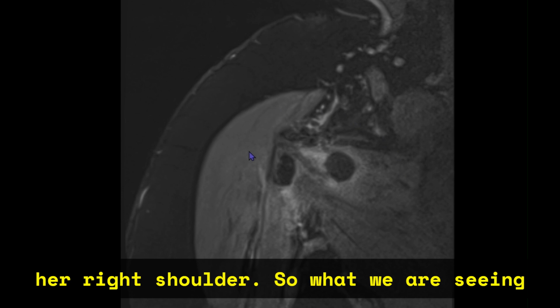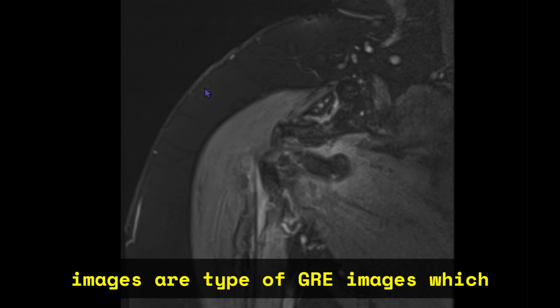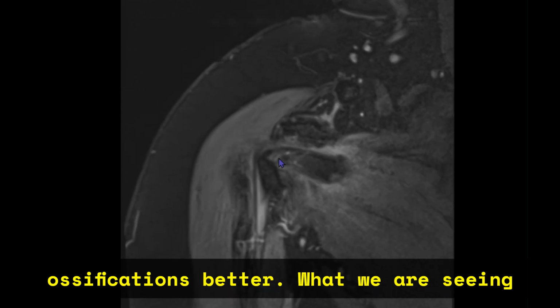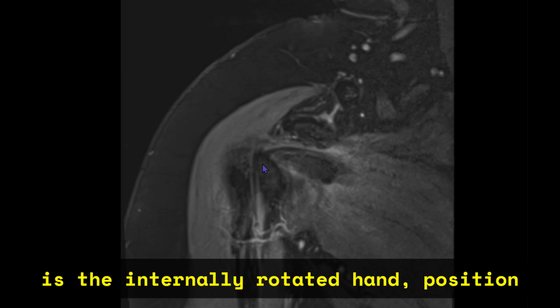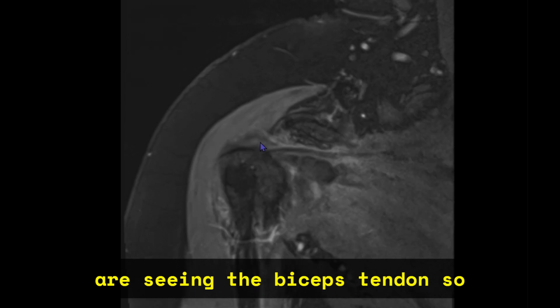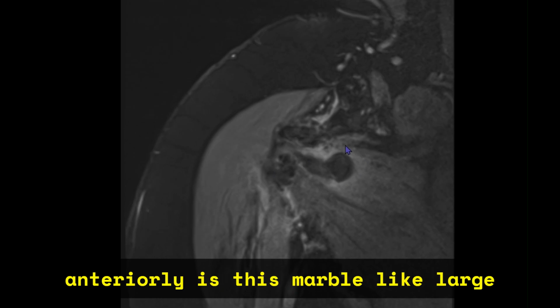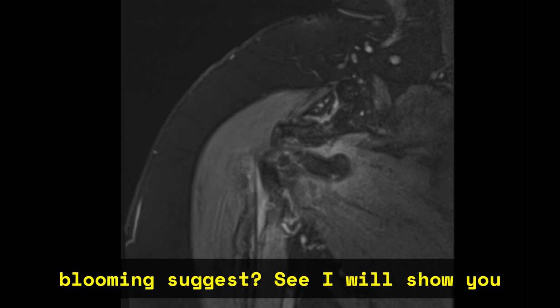So, what we are seeing is coronal MEDIC images. MEDIC images are a type of GRE images which help us see the calcifications or ossifications better. What we are seeing is in the anterior aspect. So, this is the internally rotated hand position of the humerus. So that's why we are seeing the biceps tendon so anteriorly. What we are seeing anteriorly is this marble-like large chunk of blooming. So what does this blooming suggest?